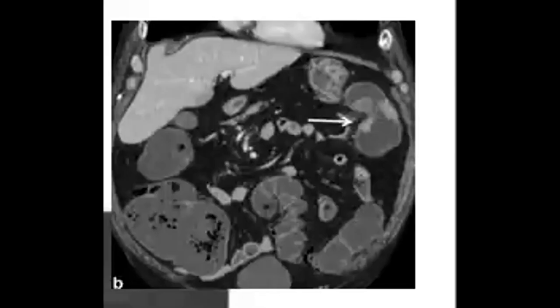In the large bowel, as we talked about the small bowel, there are types of cancer that can happen and make the picture of apple core, or in general, there is shouldering. And usually the colon cancer can metastasize to the liver, giving a target sign in the liver. And if you find a type of cancer in the colon, you have to check for other lesions.